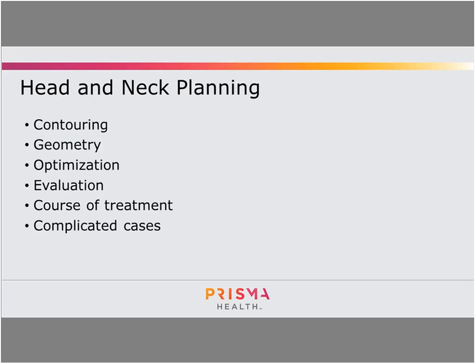So things we're going to go over is contouring, not contouring like the normal structures, but contouring that'll help in your optimization. So coming up with different planning PTVs and things like that that'll help move things along quicker. I'm going to go over geometry that we use in our clinic and have kind of adapted, and then talk through some optimization techniques, a really quick explanation on evaluation for different things, go over a course of treatment.